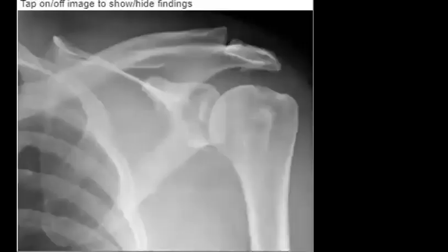Okay. And here, what is the abnormality? I know that for you now it is easier because we already saw much harder cases, but let's just do some brainstorming.